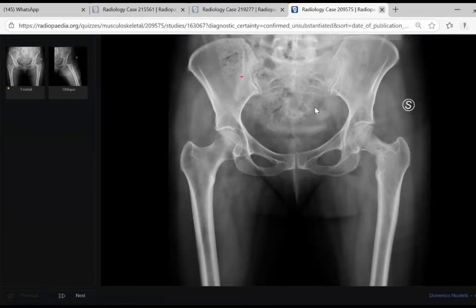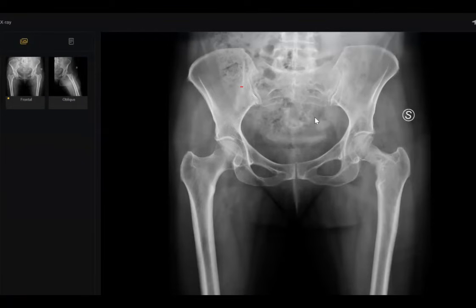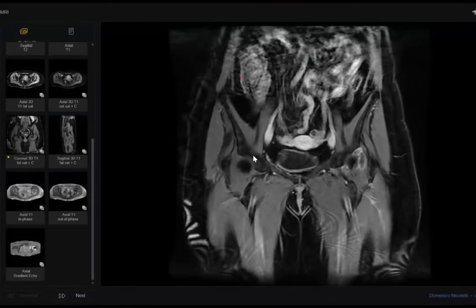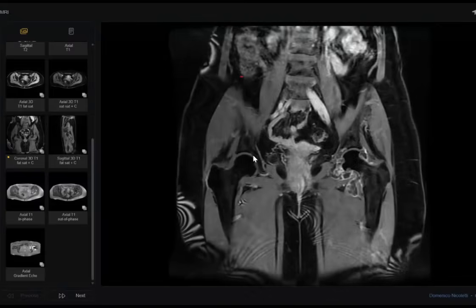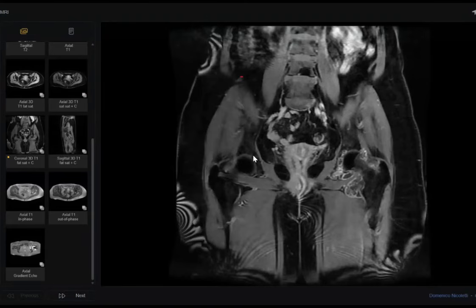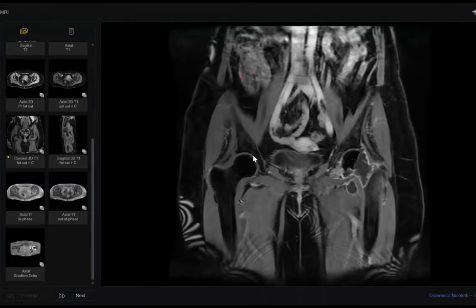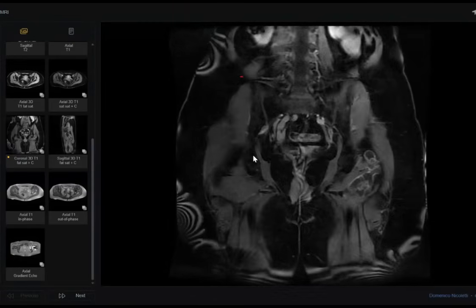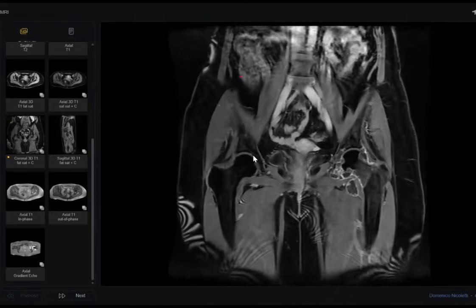Next candidate. Yes, sir. Assalamu alaikum. Somebody, can you show the contrast study? I think no contrast here. Contrast in the MRI? Yes, there is contrast. Please, our candidates who requested the contrast, can you open the mic? This is the contrast. Hello? Anyway, this is the contrast.